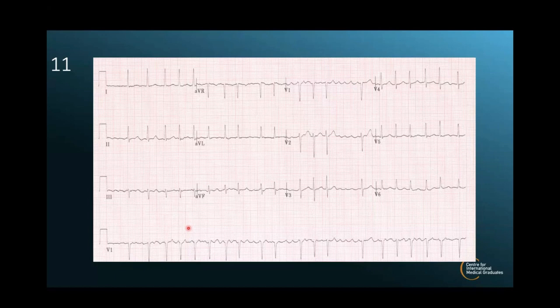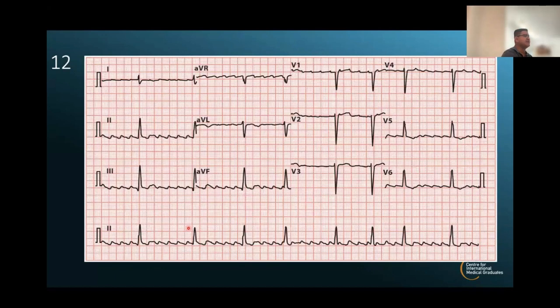All right. Common scenarios. Let's go into another one. This is a 45-year-old gentleman with a 24-hour history of intermittent palpitations, and has a reduced exercise tolerance, and goes to see the GP. GP does an ECG and finds it's abnormal and refers to A&E. The patient is not complaining of any pain. There's no blood pressure issues. There's no signs of heart failure. Can someone new talk me through this ECG and next best steps, please?